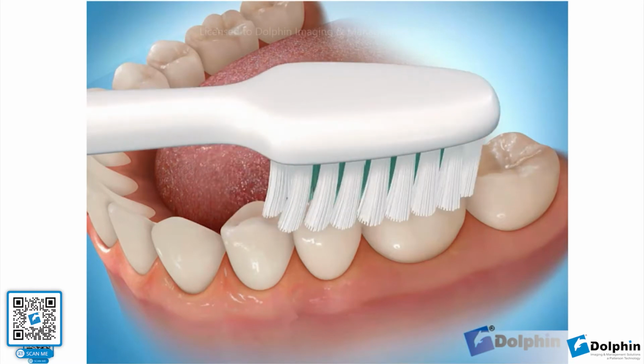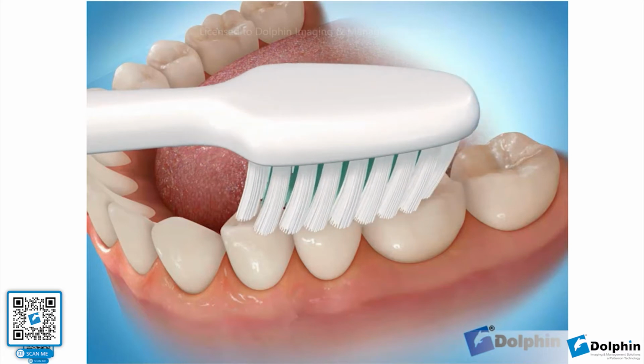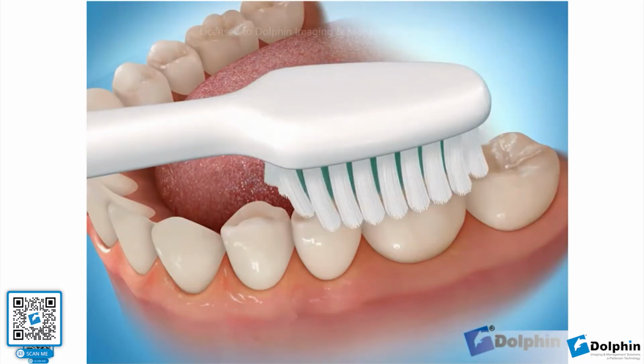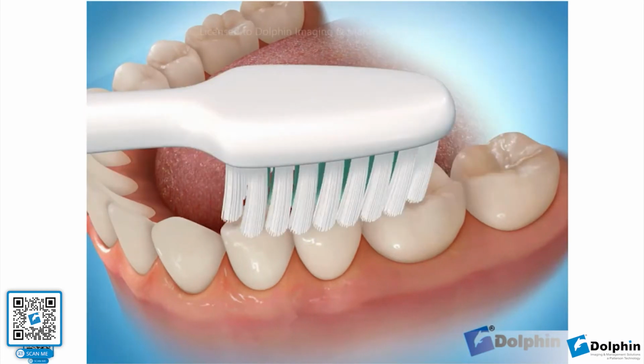And we can also click on the slider itself. So if I need, as I'm talking to the patient or mom and dad, to review a topic that we were discussing, I can simply click on the slider, drag it and repeat it. So I can explain, this is why we want to properly brush our teeth. So you can also control that as well.